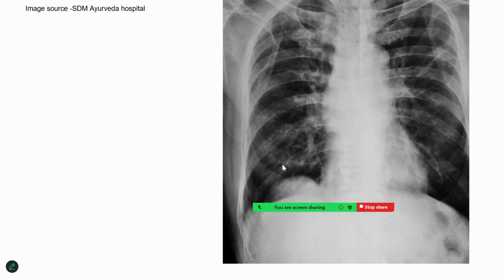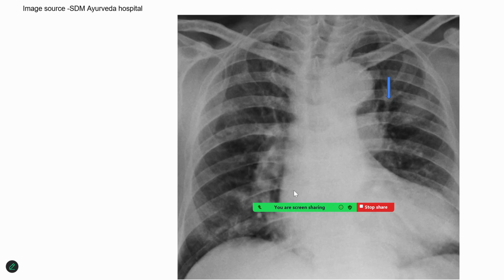A nodule, when it becomes bigger, and it is located elsewhere other than the hilar area, of course, it becomes somewhat easier. The consistency could be very opaque, and when you find an opacity of that sort, it would be a diagnosis of tuberculosis, these neoplastic conditions.